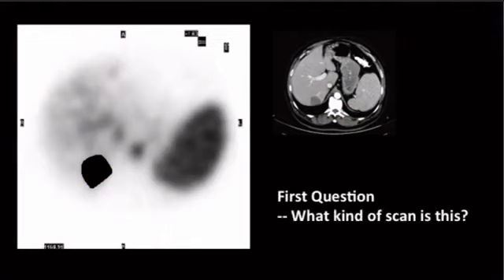This is something else that I mentioned in, I think it was the GI talk: if you're given a SPECT image that's through one plane and it's a liver lesion, how to work through what the test is. So first question is, what is the scan? That's always the first question. Anytime you're given a nukes mystery thing that's like a two-parter, they're not asking what the scan is, they're asking you what the imaging finding is. Go through the process, make sure you know what scan it is, otherwise you're going to end up getting tricked. So just reviewing that algorithm real fast here. So what scan is it?